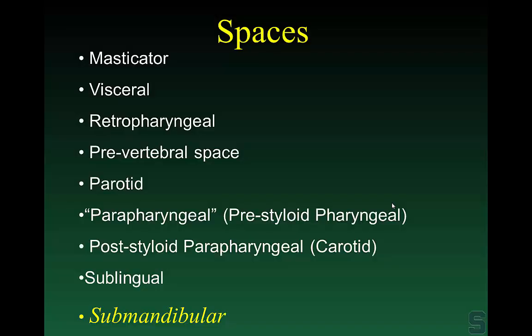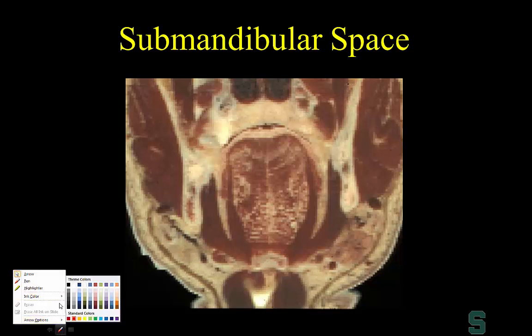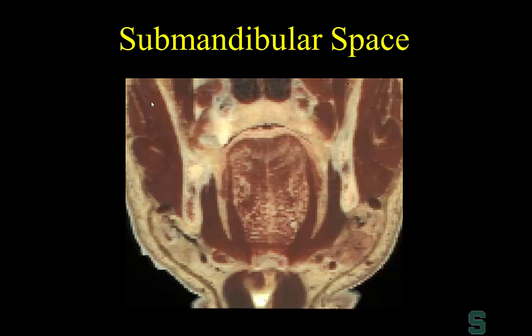And the last space that we'll talk about is the submandibular space. Now this is very easy, right? What do you call the space that's located below the mandible? Now real quickly, because I still have a couple of minutes left, I'm going to ask you again real quick. What space am I looking at right here?